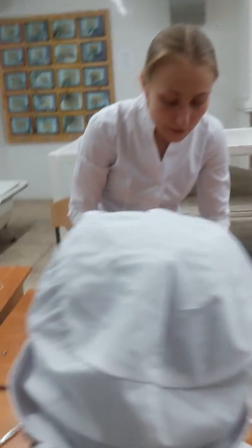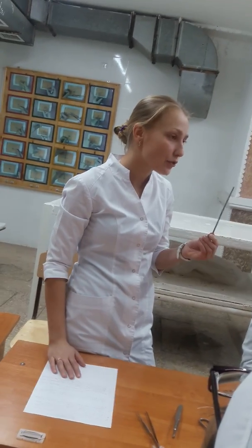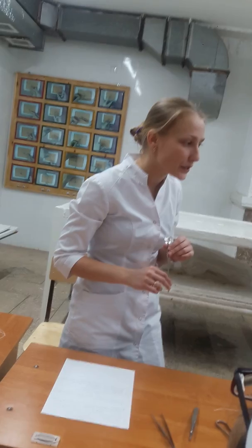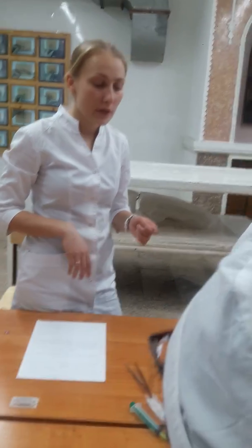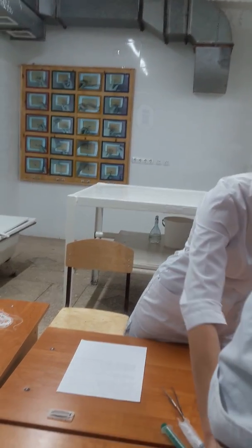Okay, what else? Probes. Probes are a special instrument to make a revision. We have different kinds of probes, but here only one. These special probes are for making an incision on a fascia. Imagine the situation. Where is the scalpel?